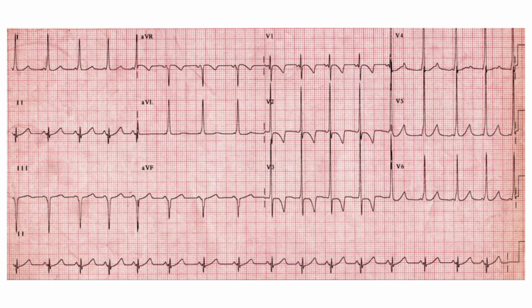If we were to look at lead 2, the QRS complex is, in fact, isoelectric. Isoelectric means that the positive and negative portions of the QRS complex are about the same size. So if lead 2 is isoelectric, remember, the perpendicular angle to lead 2 is -30. So the axis for this particular EKG is probably right at -30. So this EKG probably has a little bit of borderline left axis deviation.